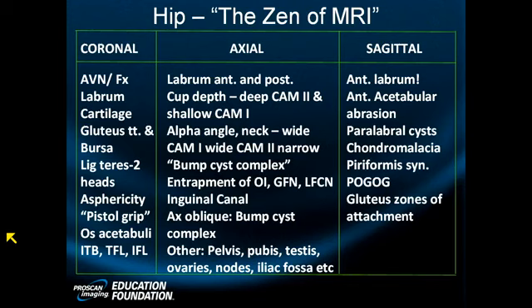Let's go to our axials and our obliques and our sagittals. Let's go to the radial. I think we got one. We do. Actually, I take it back. Let's go to our sagittal. We've got a sagittal, 2 millimeter.